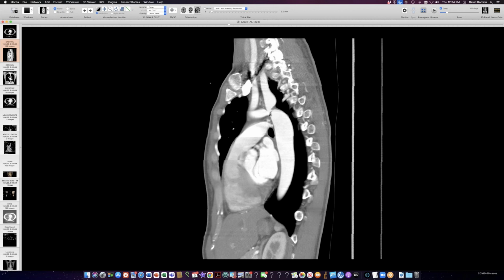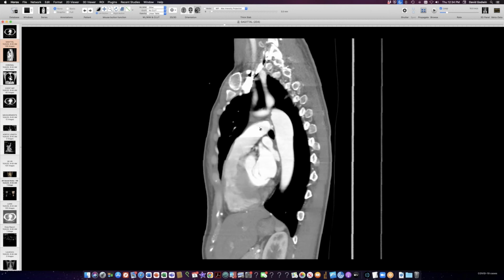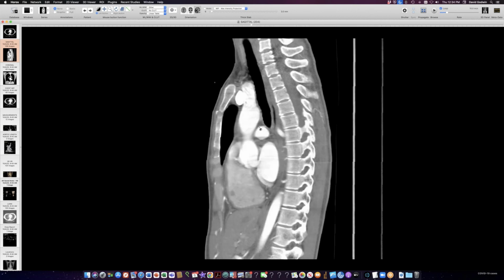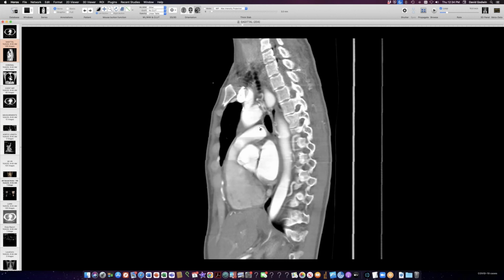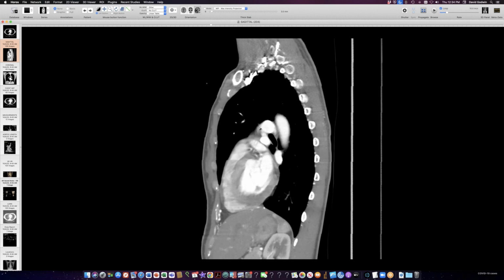In that case, the bulging upper component is the actual arch, and the waist of it is what occurs at the normal level of the typical arch, and then you have poststenotic dilation below that. So very dramatic, high degree of stenosis here caused by this coart with atresia of the arch, and not a real 3 sign, which goes again with coarctation. Not much of a 3 is fine for coart.